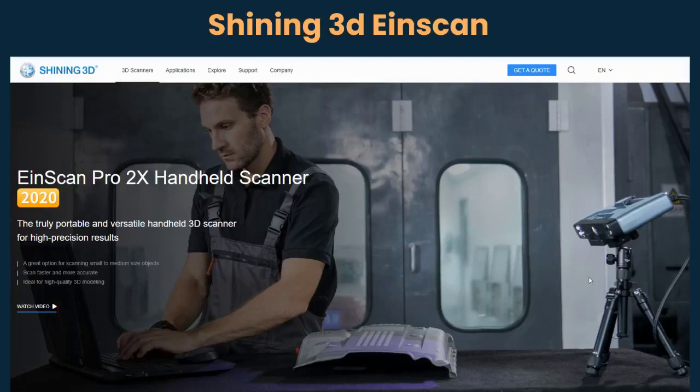The downside to that is that the software is not as optimized for dentistry, meaning that it's not going to prompt you to take all of those various scans. You'll just have to treat them as individual scans and then stitch them after the fact, which is not the end of the world, but it's not quite as streamlined.